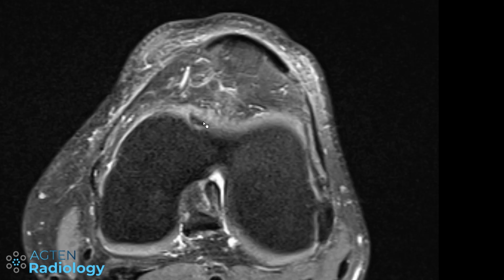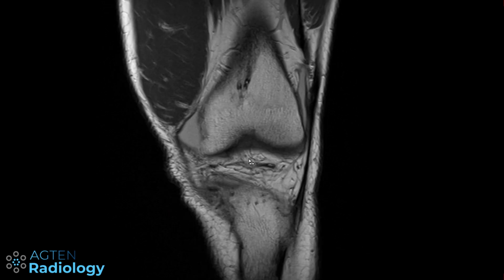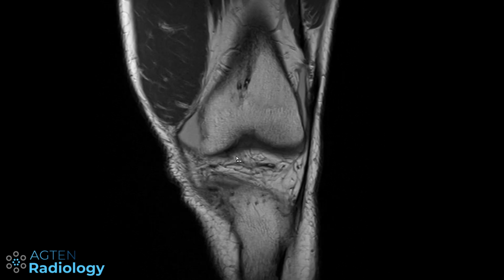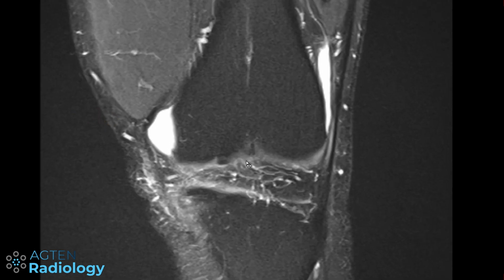In this patient we even have a cartilage defect here at the medial facet of the trochlea, and you can also nicely see this here on your coronals, the black line here in the cartilage consistent with a fissure, and here some cartilage abnormalities just medially. And here again to show you that you can also see this on your coronals.